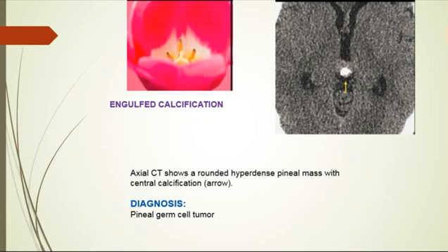So what is the differential diagnosis for pineal region solid masses? Pineal parenchymal tumors in general, like pineocytoma and pineoblastoma, of course germ cell tumor, metastasis, gliomas, lymphoma, neuroendocrine tumor, even meningioma, vascular lesions can happen here. The clinical symptoms include Parinaud syndrome, which is what? Upward gaze palsy, exactly. Headache, ataxia. So to determine whether the lesion is pineal or parapineal in origin, you should review the images to identify the pineal gland and the surrounding structures. Okay, you look for the.